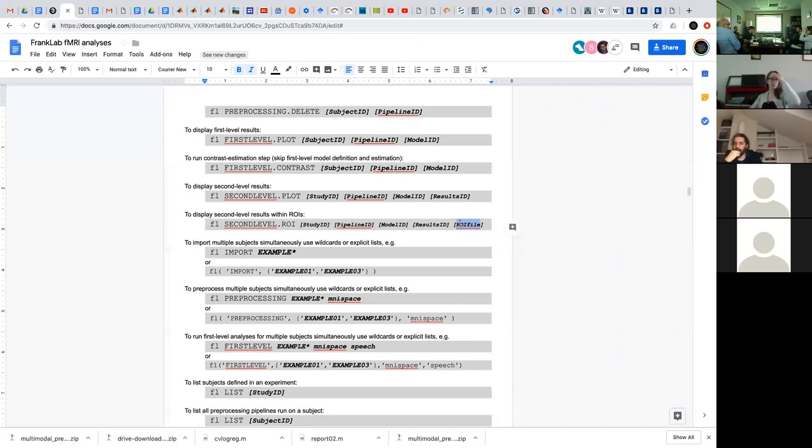I feel we could do something similar with the ones that I've already made, instead of just taking everything where the most likely label is the highest number, to say only take the ones that I actually have. But I think we could do some kind of threshold.